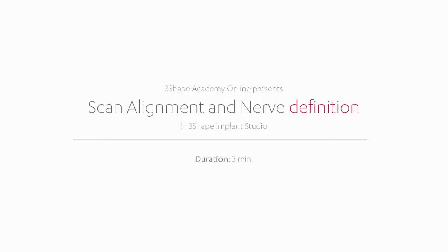In this video you will learn how to align a CT scan with a surface scan and how to define the position of the mandibular nerve.